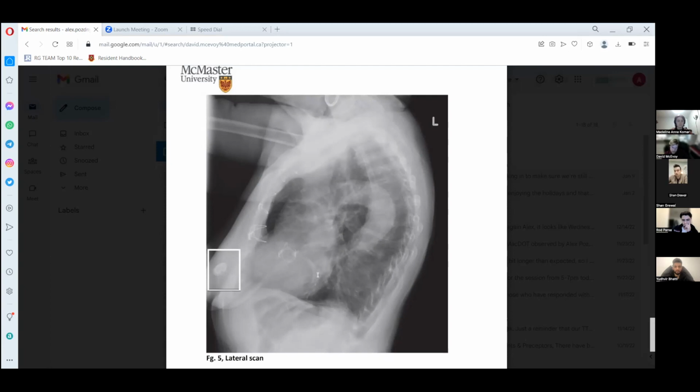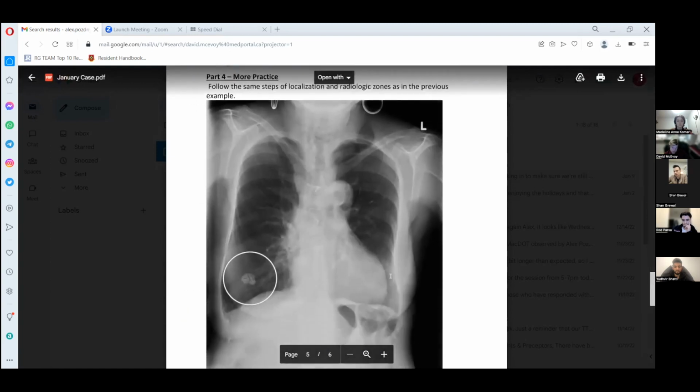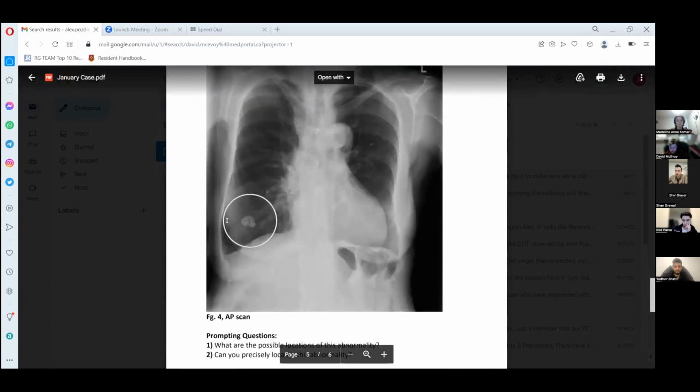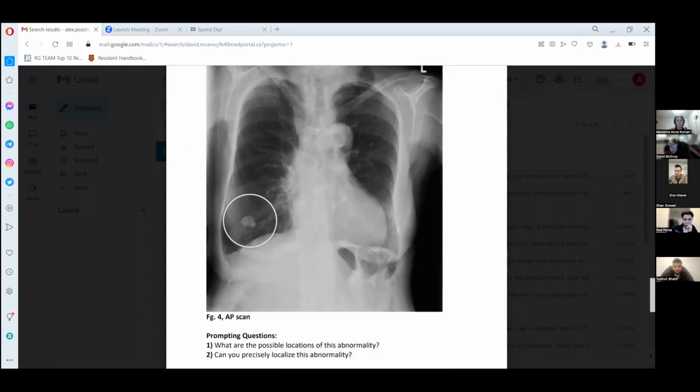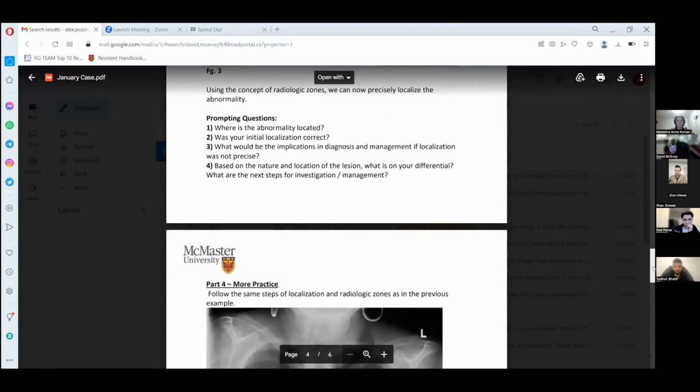So it could certainly be that they might have a bit of cardiomegaly, but I wouldn't necessarily call it from an AP, just because it's an AP view. From a PA view, for sure, you could maybe say it's pretty large. You can say that it's borderline enlarged, and the cutoff on a PA radiograph is usually more than 50% of the thoracic diameter. So you measure the lungs from one side to another, and then you measure the heart. And if it's more than 50%, then you have cardiomegaly on your radiograph.